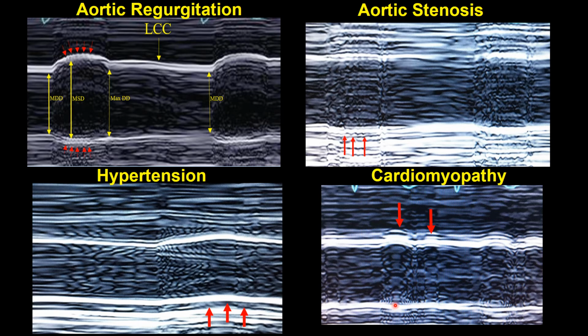In cardiomyopathy, we can see the double pulse in a severe cardiomyopathy. Right here is systole, and then systole ends and we get a long period of flow reversal, which is something I completely unexpected, that flow reversal would be an important part of cardiomyopathy. Then we get the secondary pulse, which is actually occurring in diastole.